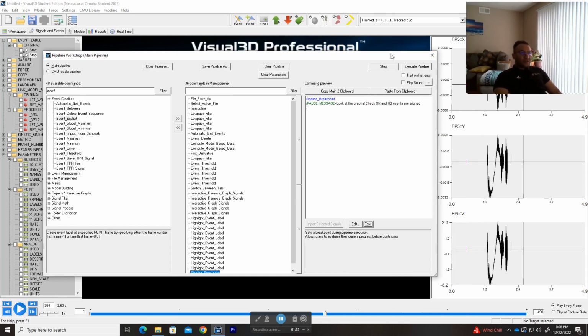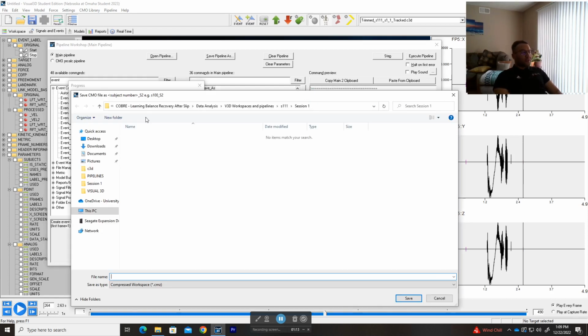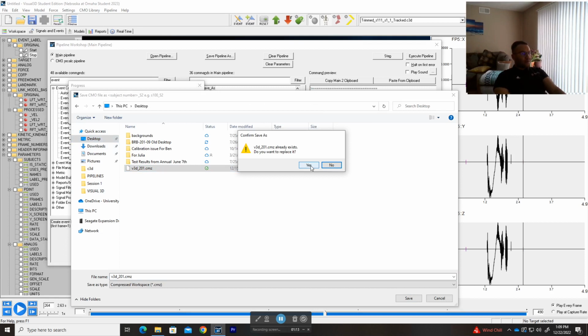So let's go ahead and run this pipeline, execute it. Okay, let me just double check I have everything correct. So it seems fine. Alright, so everything is fine. I'm just gonna execute it. It's gonna ask me to save it. I'm gonna go ahead and save it on the desktop. I already saved it, but it's fine.